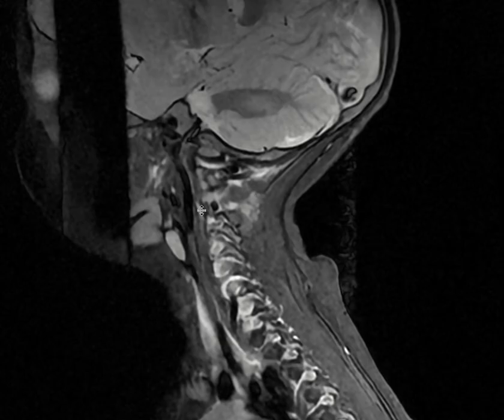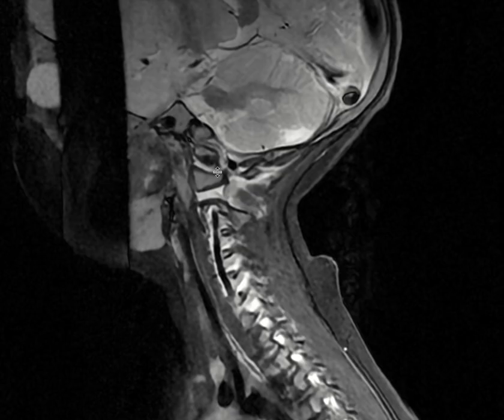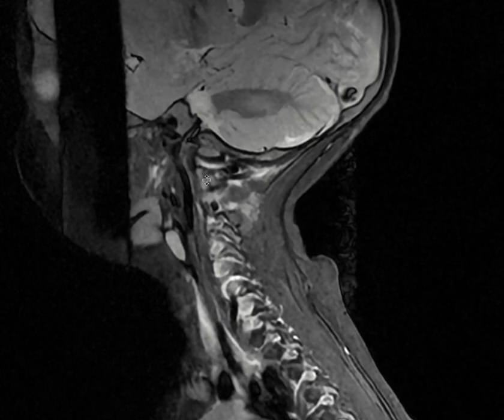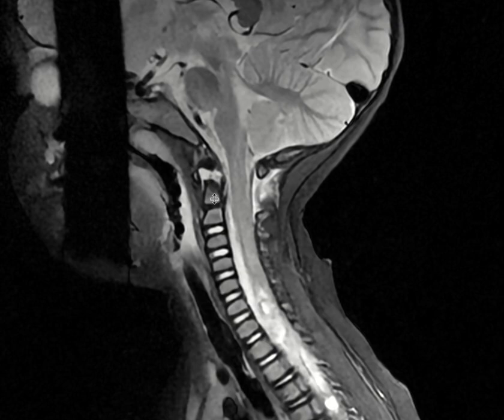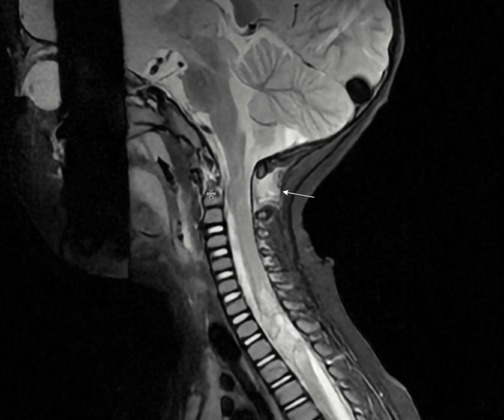Also, you see that these distances we already saw widened on the cervical spine CT now show fluid, and there is widening between the atlanto-occipital joints and also the atlanto-axial interval. As you see, there is widening and there is fluid signal in it. So these are all indications of ligamentous injury. There is also fluid signal and widening in the atlantodental interval. Based on this, we already know that the tectorial membrane is disrupted.